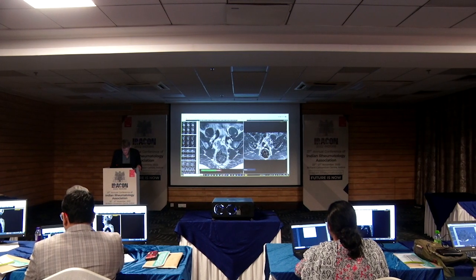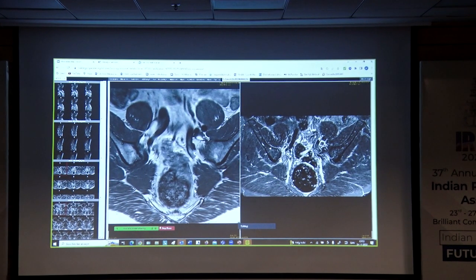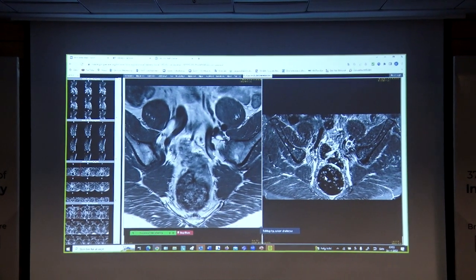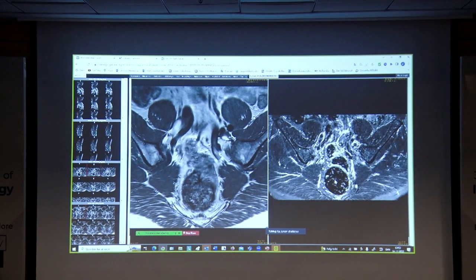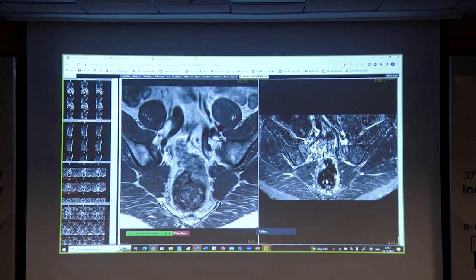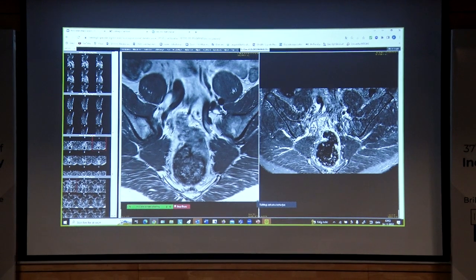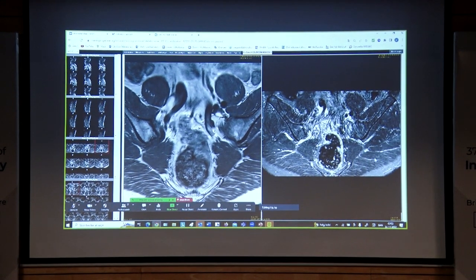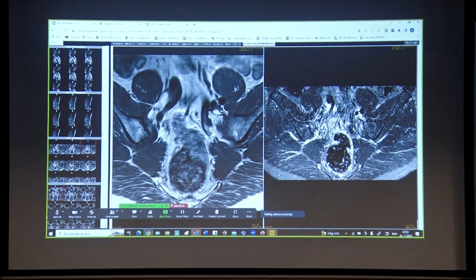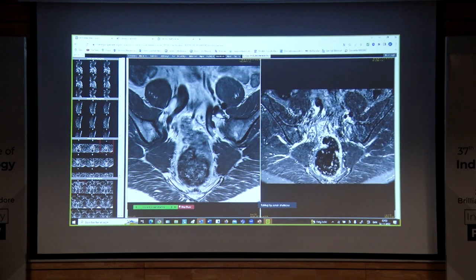The images do not fit. There are 16 STIR images and 13 T1. So you should, in reality, take the STIR image and go to image 3 before you link them, and then you should link. So STIR image 3 with T1 image 1. If not, you will manage, but it's better. And then you should enlarge the STIR image a bit.